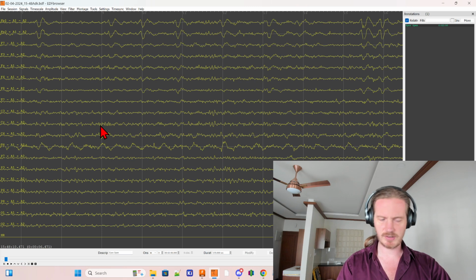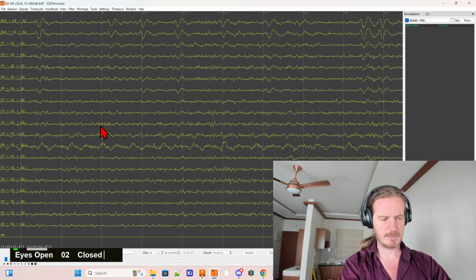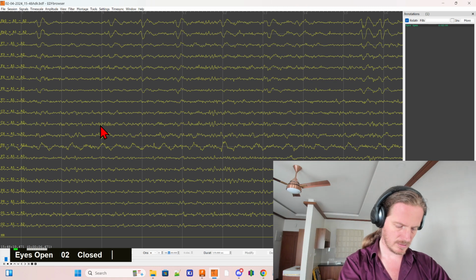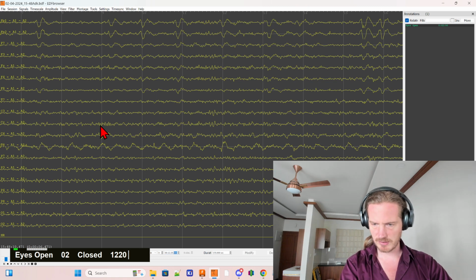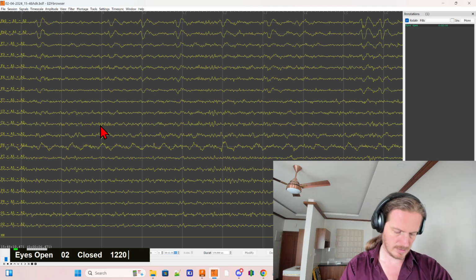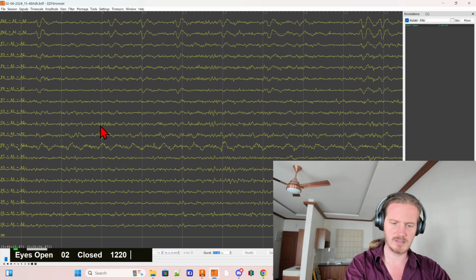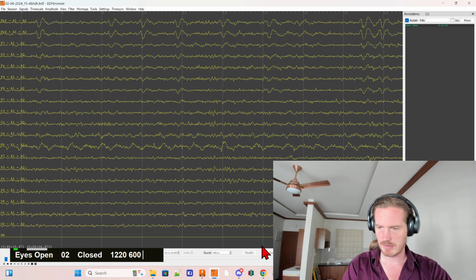Okay, let's make the next annotation. Eyes closed. And again, I navigate here, and this will be at 12 minutes and 20 seconds into the recording. And this will be a period of indeed 10 minutes, according to my notations. So create. Great. So now we have these two periods of annotations.